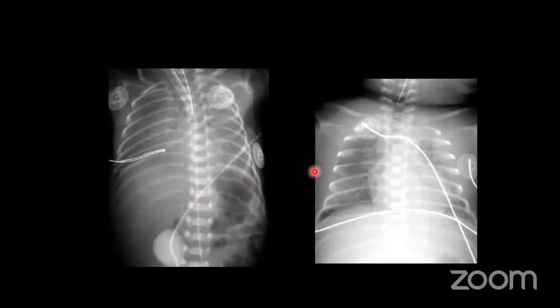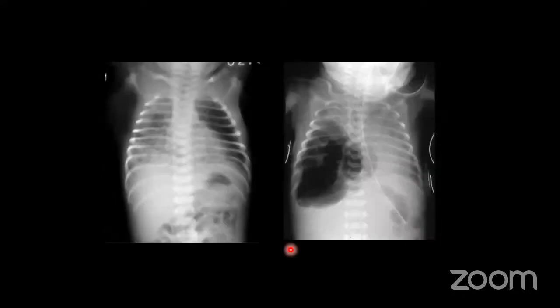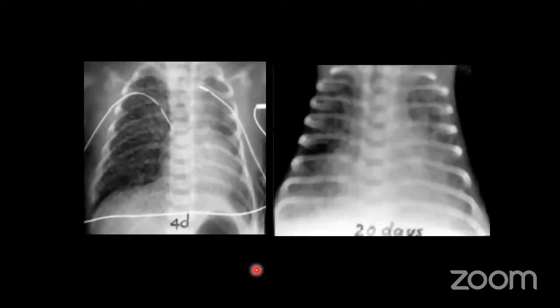And this is mostly iatrogenic. When you give barotrauma, the earliest radiological feature is pulmonary PIE, pulmonary interstitial emphysema. If you go on continuing with this barotrauma, what will happen? This will coalesce and form these cystic lesions. So be very careful when you give much more pressure.